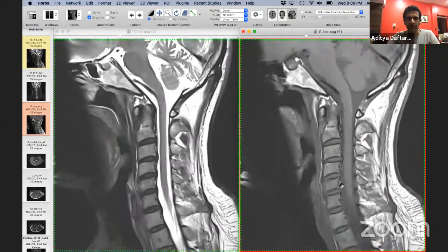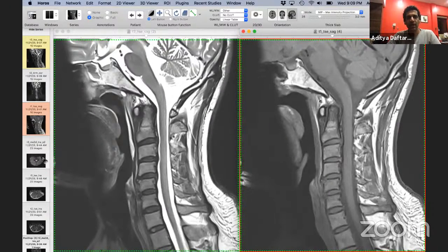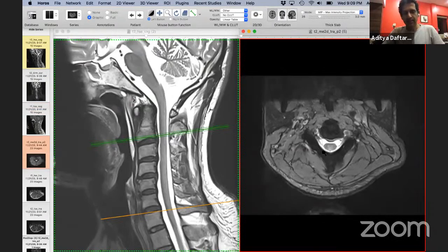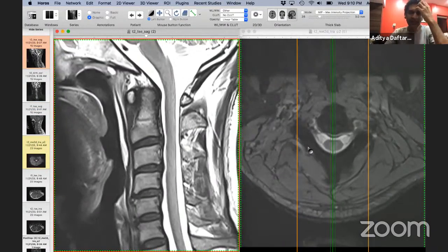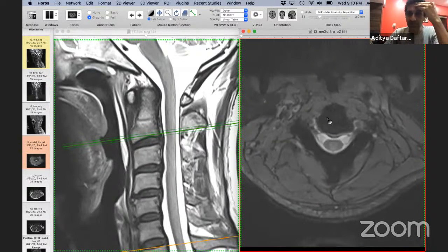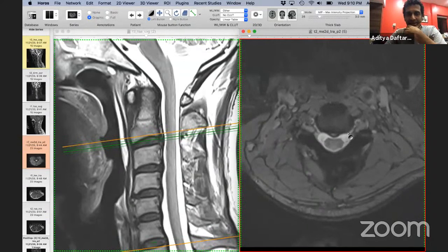So look at both the T1 and T2 weighted images. Now, most centers that you'll get images from will, in the interest of time, end up doing only axial gradient echo images. These are faster to acquire. We can get thinner images. And the other thing that these images do is they help us to differentiate soft versus hard disk.